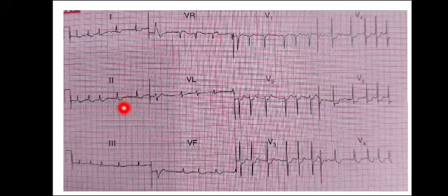And when we talk about atrial fibrillation, you tell the ventricular rate, and after the rate and rhythm, we talk about the axis, lead 1 and AVF. In lead 1 and AVF both are upward, so the axis is normal. And then we start looking at the QRS complexes. So QRS, these are normal in lead 1.